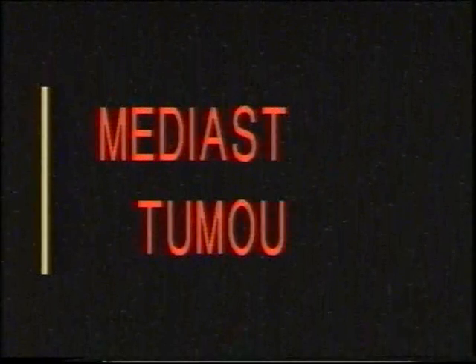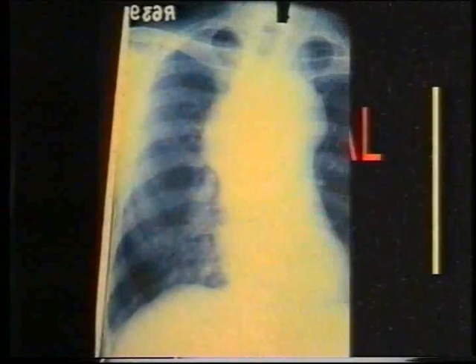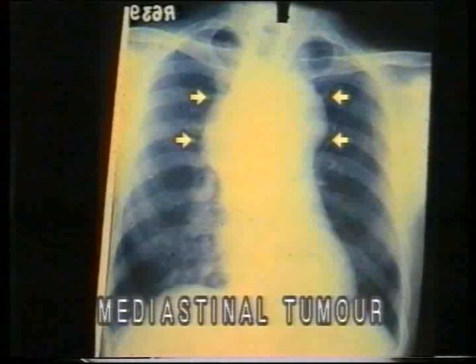Mediastinal tumors. Mediastinal tumors are seen as a widening of the mediastinum, either on both sides or sometimes only on one side. Note in this X-ray the widening of the upper or superior mediastinum. Note the smooth borders of the opacity where it is meeting the lungs, and note that it is lobulated. Lobulated smooth margin is characteristic of enlarged mediastinal lymph nodes.